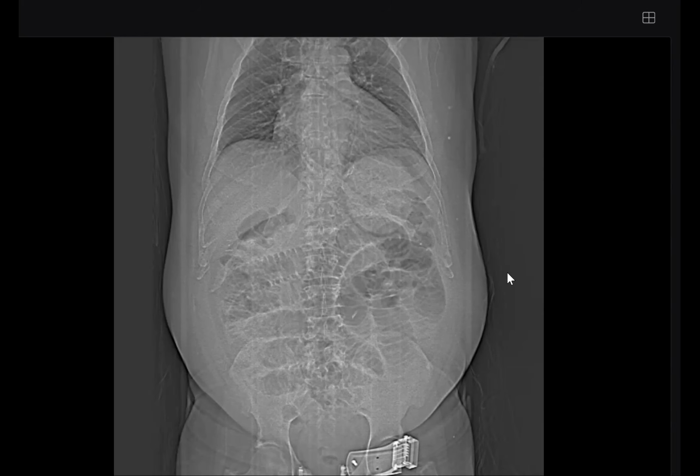The hernial orifices are not clearly covered in the scanogram, so I would like to correlate my findings with the corresponding CT. And I don't see any surgical clips, which might signify any prior history of surgery. So I would like to move on to CT for evaluation of any particular cause for this intestinal obstruction, and I would like to urgently inform my referral for these findings.